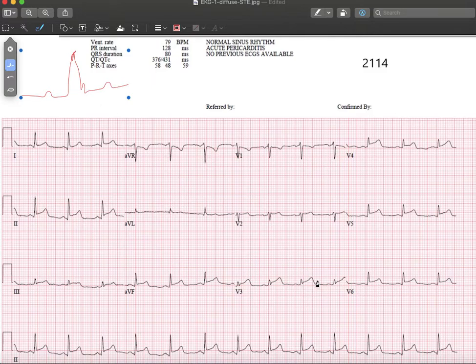So an angiogram was done on this patient and showed that this patient has complete acute LAD occlusion. In cases where you have LAD occlusion, you might expect ST elevation in the anterior leads as well as the lateral leads, because as you know, the lateral leads are supplied from the diagonal branches of the left anterior descending artery. But what's happening here? Why are we having 2, 3, AVF? This is a pattern of injury of inferior myocardial infarction.